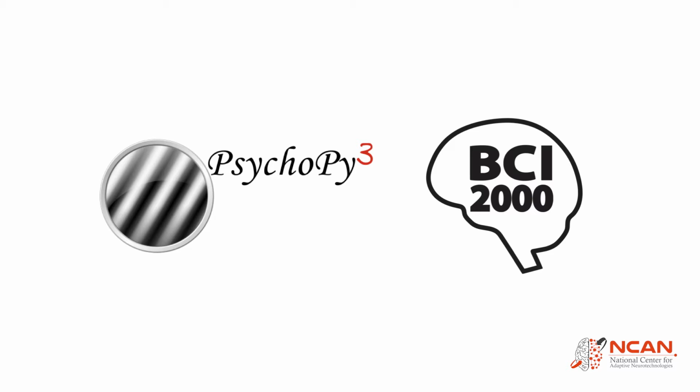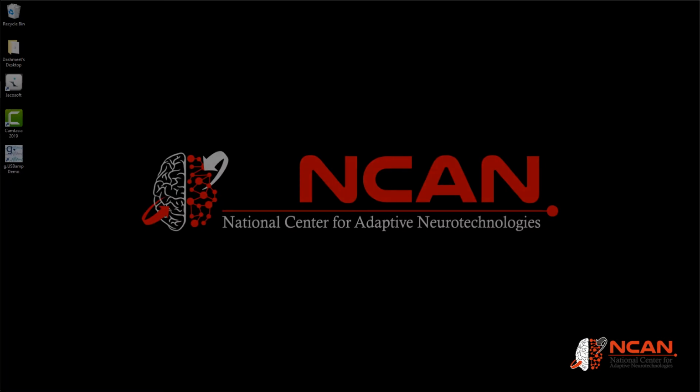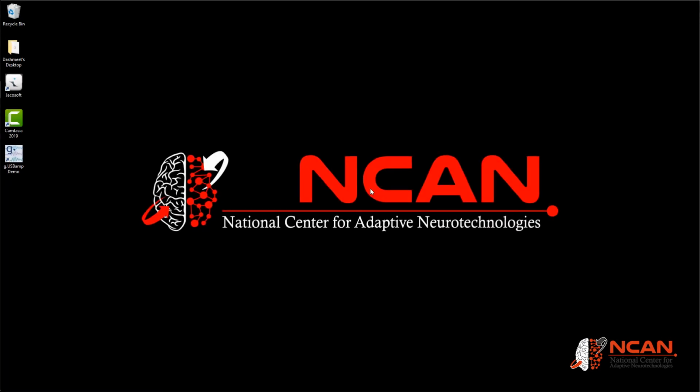PsychoPy. Subject responses from PsychoPy can then be collected and synchronized with his or her biosignals by BCI 2000 for future analysis. More information can be found in our BCI 2000 wiki page with keyword PsychoPy. This video will demonstrate how to connect a standard PsychoPy experiment with BCI 2000 modules. We also include examples of the application using a PsychoPy demo experiment.